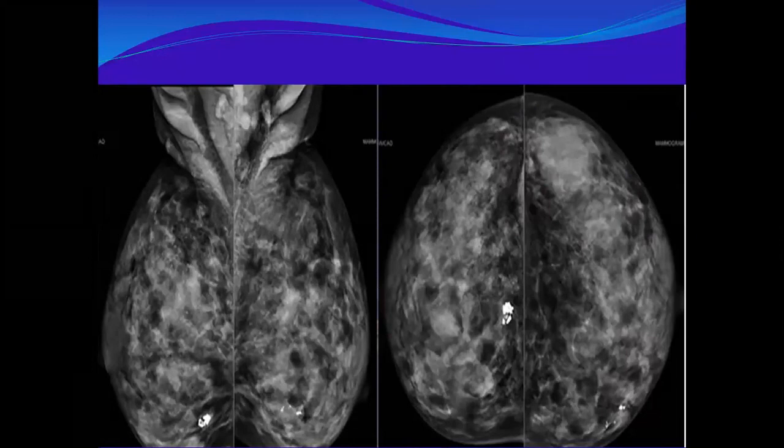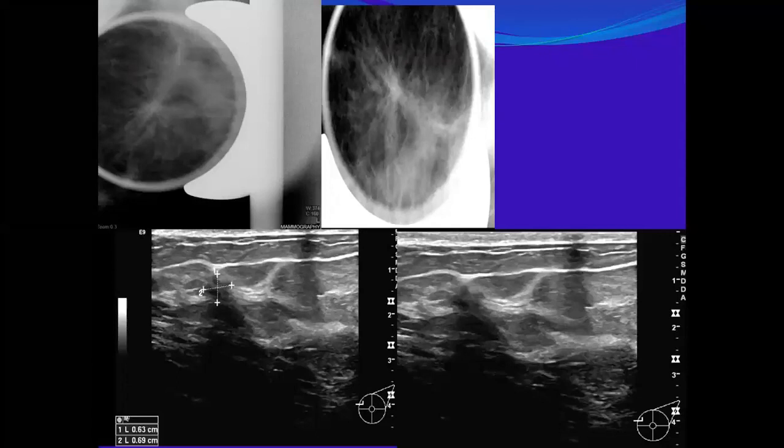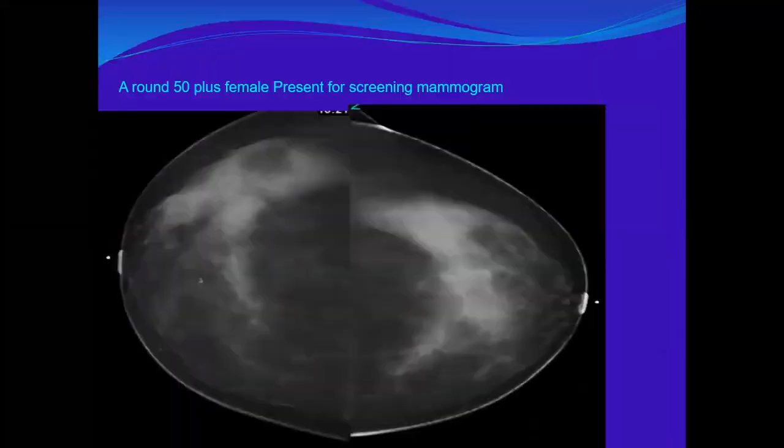Quickly, we want to go through many examples. Dr. Rabab, for the previous patient, the first image, here, the right breast. What about the hypodense area in the upper part? Can I consider this a normal variant? This area? Is it asymmetry? No, this is a fat lobule.